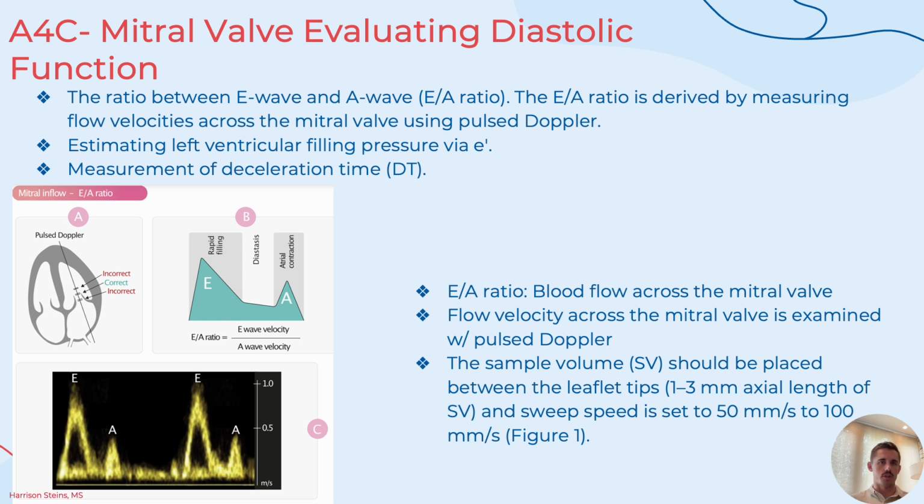This is somewhat out of the scope of this lecture, but I think it's important to know that there are additional measurements for each of these valves, for each of the flow rates, so that we can evaluate diastolic, systolic dysfunction, or global heart function.